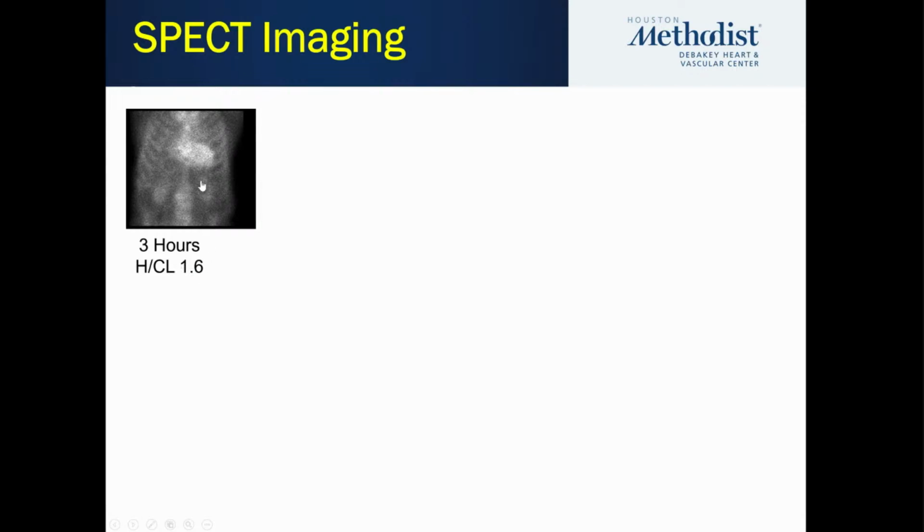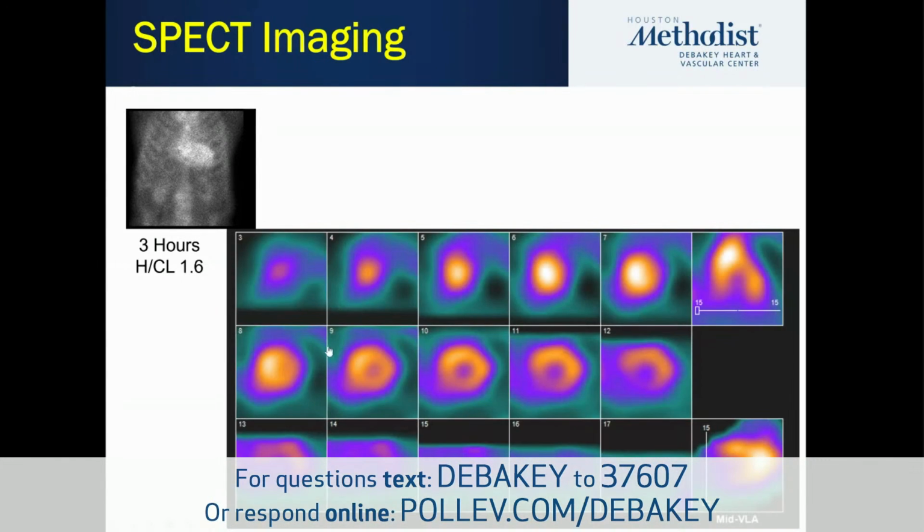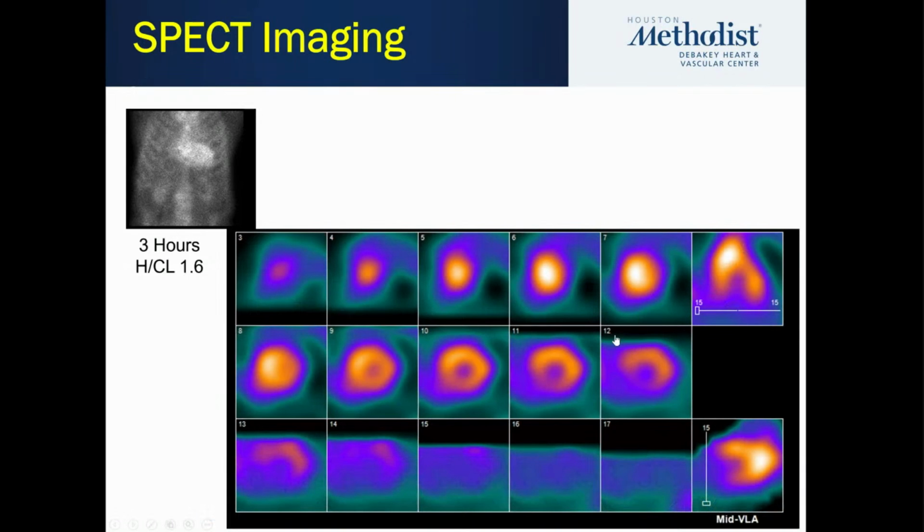So this one you're pretty sure, but you still want to confirm that this is not a blood pool, especially in low ejection fraction patients. And when you do a SPECT imaging, you can clearly see that the uptake is in the myocardium.